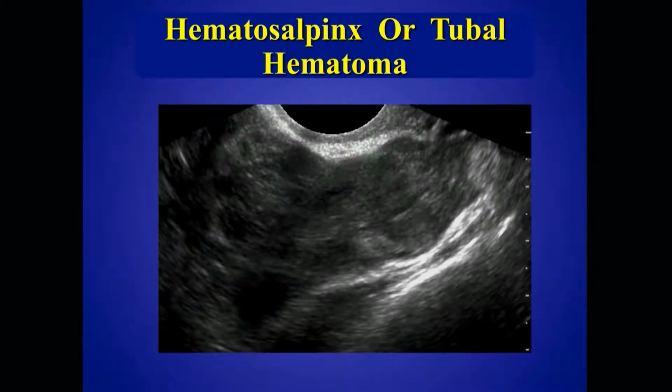Another pitfall is when we don't see the tubal ring and we sometimes mistake large masses because we're not thinking ectopic pregnancy. Here's a patient that has a large clot sitting in the fallopian tube, a so-called hematosalpinx. It's just distended with blood because the ectopic has ruptured. Again, I've seen this missed because people are looking for rounded masses, not paying attention to the fact that we do indeed have this echogenic mass sitting in the adnexa representing the location of the ectopic.